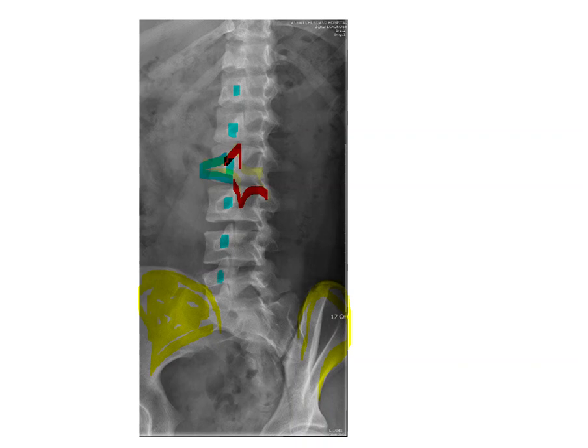And then we're going back around here, and this is his back, right here. So all of the structures that I'm labeling here are all part of the lumbar vertebra. So here we have, I'm going to erase this so I can go in more detail here and try to outline what we're seeing.